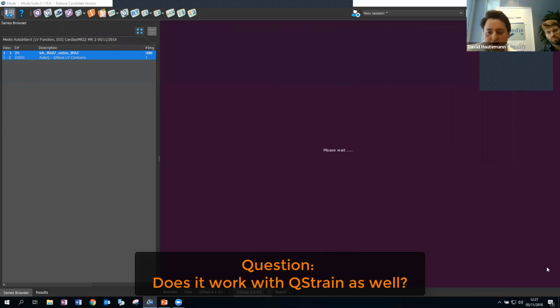It will compute a little bit longer because we're doing now endo and epicardial contours. But basically, you can then load them into QStrain and do some advanced wall deformation analysis on the short axis contours. I think in the future, when we also have something for the long axis, then we could also do that. And we're also in the process of automating it more.